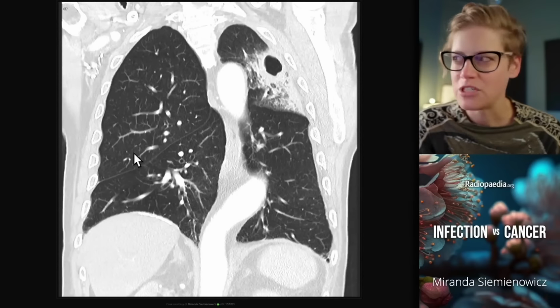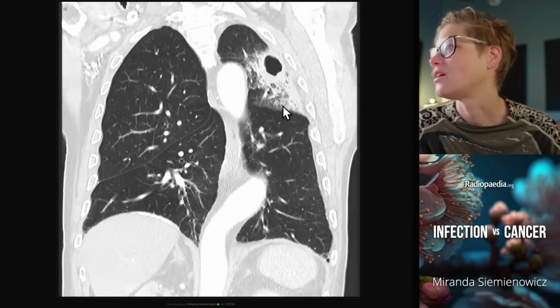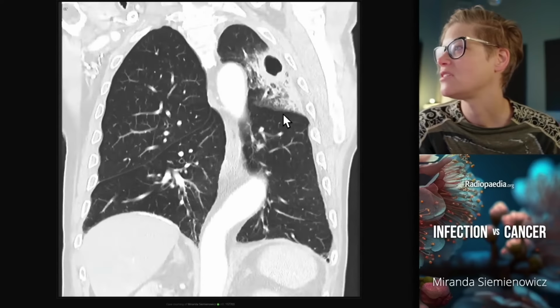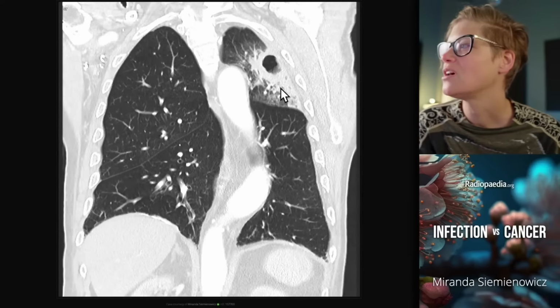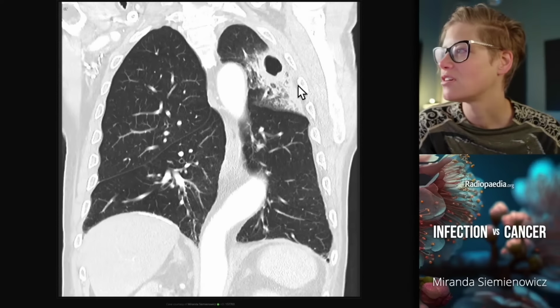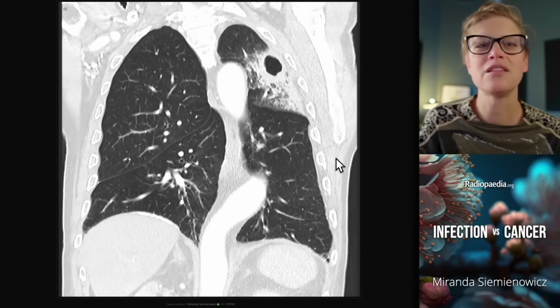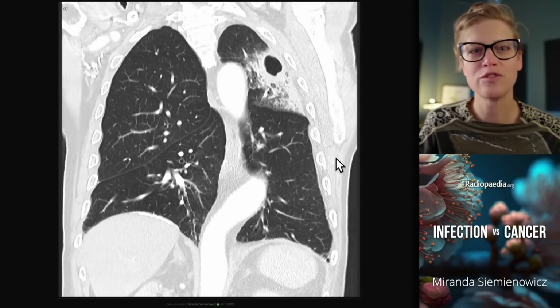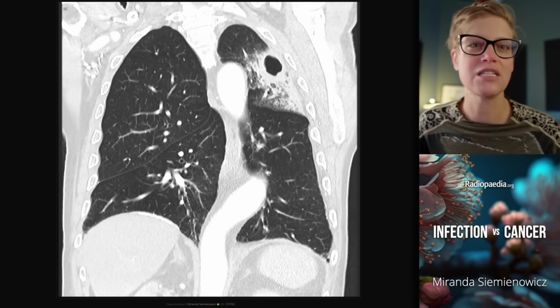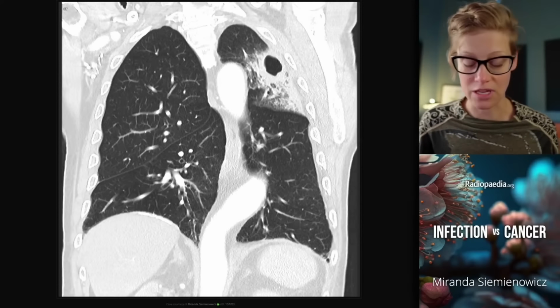Let's have a look at the coronal images and see that, again, that consolidation and ground glass opacity that's contiguous with that focal lesion occupies just as much space as the lesion itself. The consolidation is a dominant process, and these are morphological features of benignity. This is infection. This is follow-up CT in 6 weeks with empirical treatment with antibiotics.